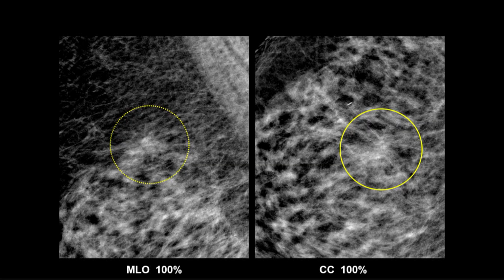So when it's not a clear-cut finding, think about using the word suggestion, because it just makes it a little easier for them to say, no, I don't think it was there. You'll appreciate it when you're at the diagnostic end.